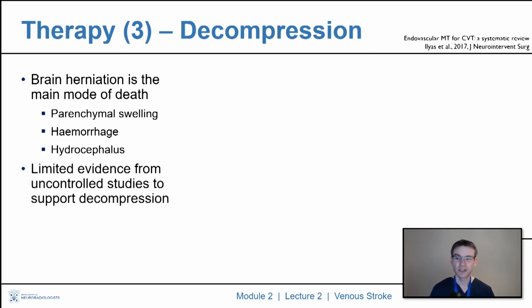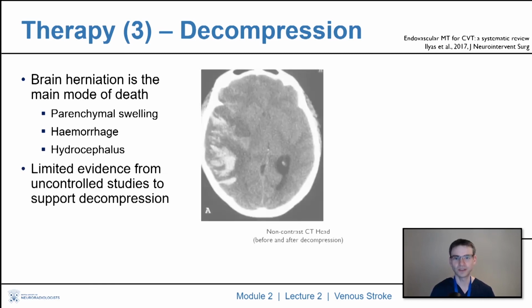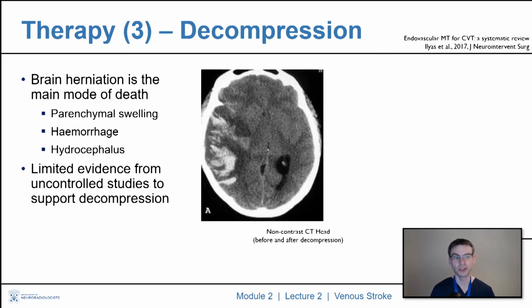There is some limited evidence from uncontrolled studies to support decompression, but it's really a last resort for the deteriorating patient. So here's a non-contrast CT head on the left showing you before decompression with a large venous infarct with hemorrhage, midline shift and effacement of the ventricles not long after the time of presentation.